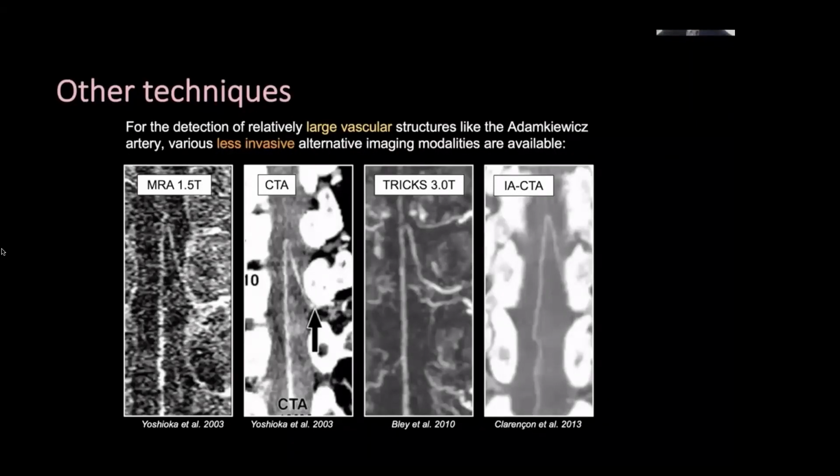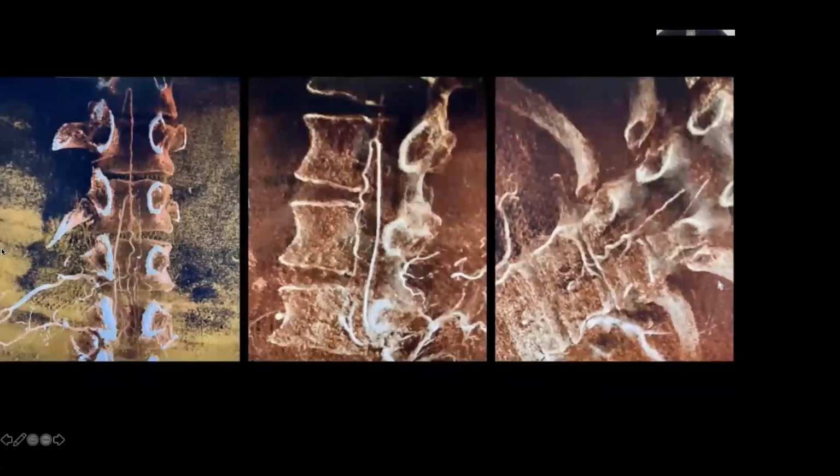That often would give, well, not always, but probably the majority of the time when there is a dural AVF, we'll be able to see the feeder on the MRA. And then that will allow us to do a limited angiogram rather than doing an angiogram of the whole spine, which is obviously preferable for the patient.